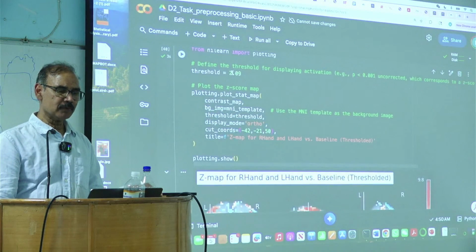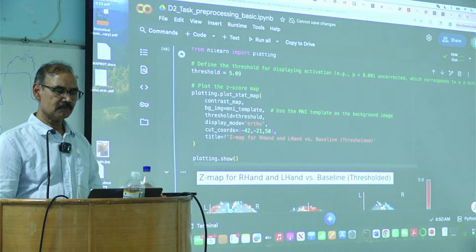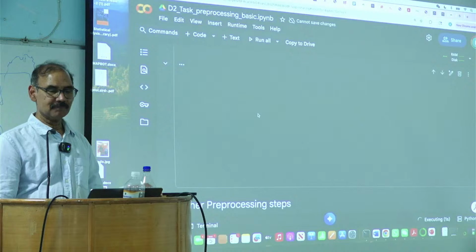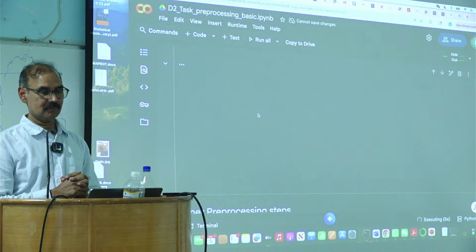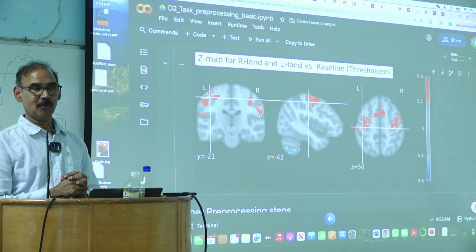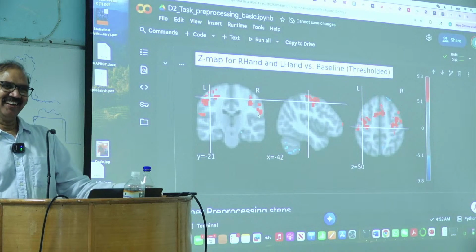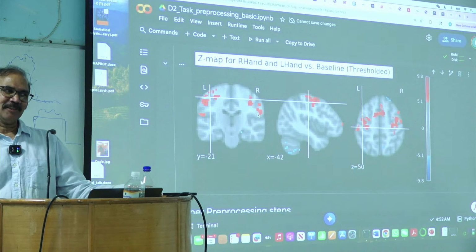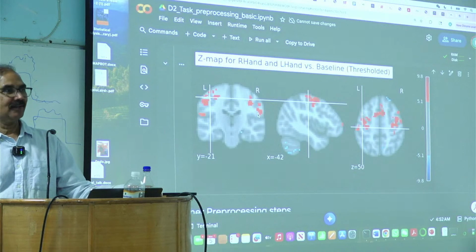Now, if I used a higher threshold, wow, such clear picture, right? So what do you think may have happened here?